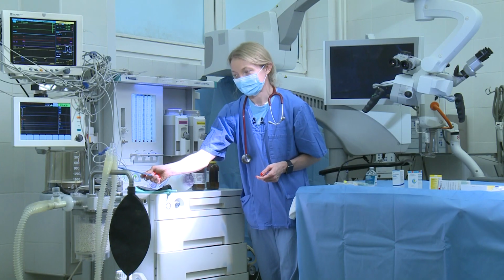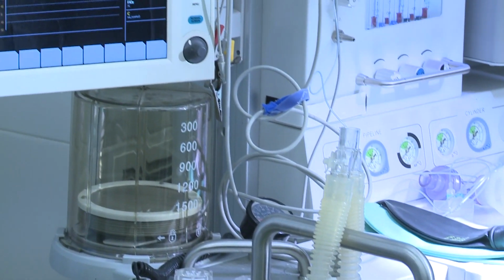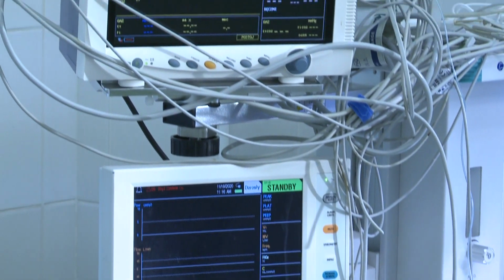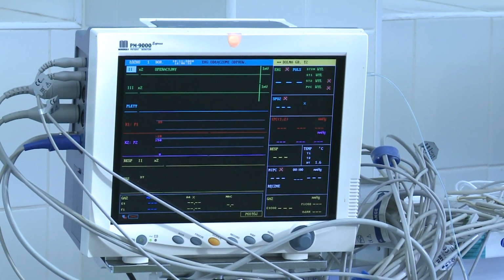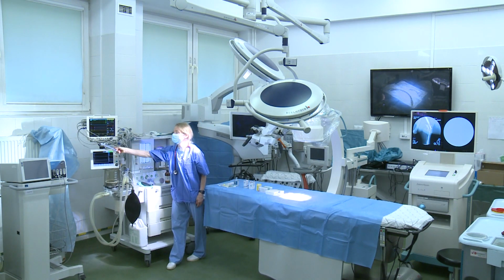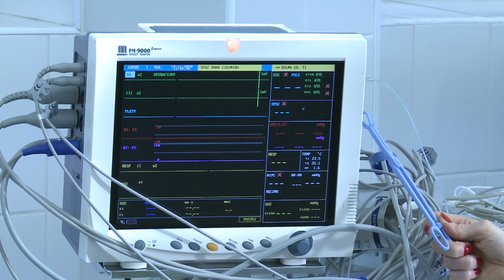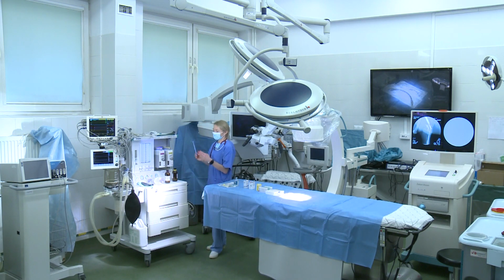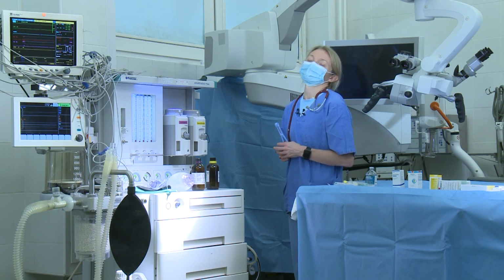bag, and pipeline system. The last element: we want to know how our patient sleeps, what is going on with our patient during the anesthesia, and how it feels. That is why we have a monitoring system. But it's another story. Today, I would like you to remember only the mystery of the general anesthesia machine. Thank you.